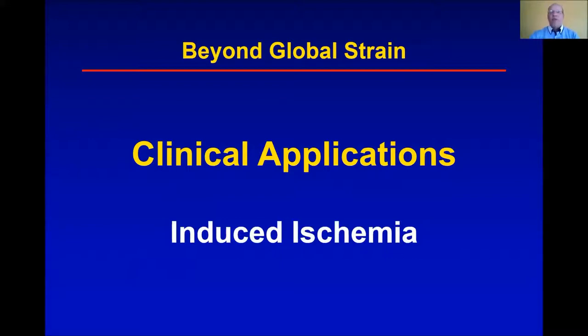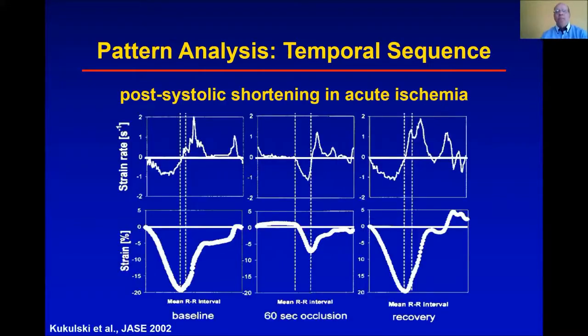Let's start with an induced ischemia. This here is an old study from 2002. This is done with Doppler strain rate and strain assessment.